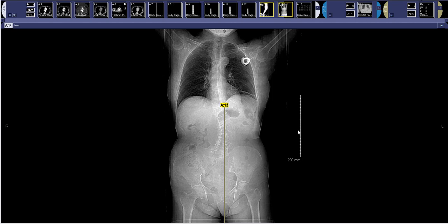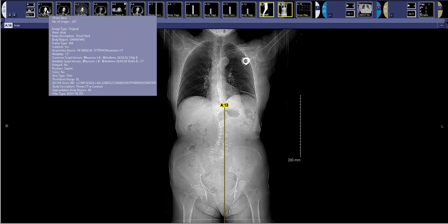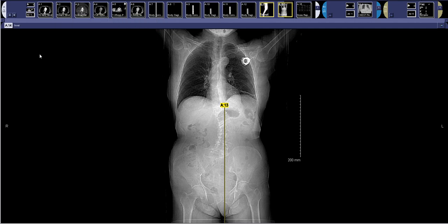The typical indication for a pancreas CT above just a standard CT is to evaluate for resectability of a pancreatic tumor. There are three main phases that we obtain, although many institutions only obtain two, and that's the arterial and more delayed venous phases. Some people call that early arterial phase the pancreatic phase. It's the phase at which the pancreas enhances most briskly, and so it's ideal to differentiate normal pancreas from tumor on that phase, as well as to evaluate for arterial contact.